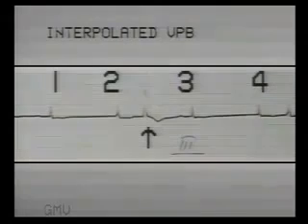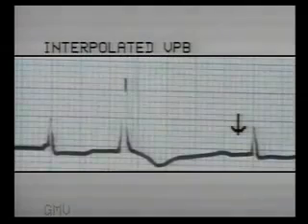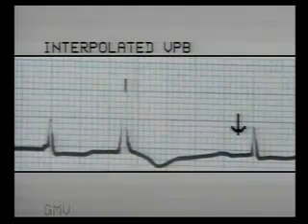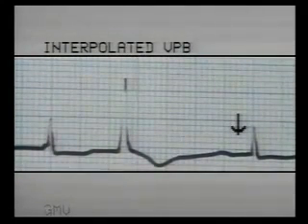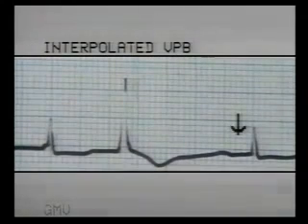But here the ventricular premature beat has occurred so early that it did not affect the AV node, which conducted the normal beat as usual. This is called an interpolated ventricular premature beat, usually seen with bradycardia. The only effect that it has on the next beat is that the PR interval is prolonged, delaying the QRS complex slightly. Otherwise, the sinus rhythm is undisturbed. Note the prolonged PR interval in the succeeding beat.